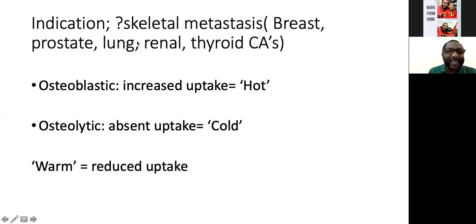Lung cancer, on the other hand, is one of the cancers that preferentially metastasizes to the appendicular skeleton. Renal and thyroid cancers are the two cancers that have pure osteolytic lesions and can sometimes be very notorious and difficult for us to diagnose on bone scan. It is easier to see osteoblastic activity on a bone scan than osteolytic activity. Again, I'll show you a few images that display the scans I've described.